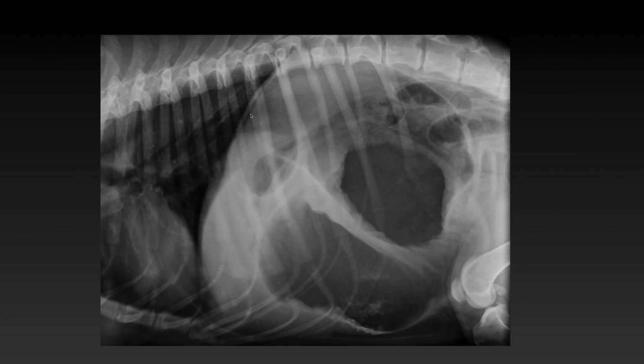but it's only seen in an area where the antrum and pylorus are also superimposed, and this might be created by the superimposition of the diaphragmatic crura and some gas in the stomach. I cannot follow this gas dorsally or ventrally. And I do not have any other signs for free gas in the abdomen.